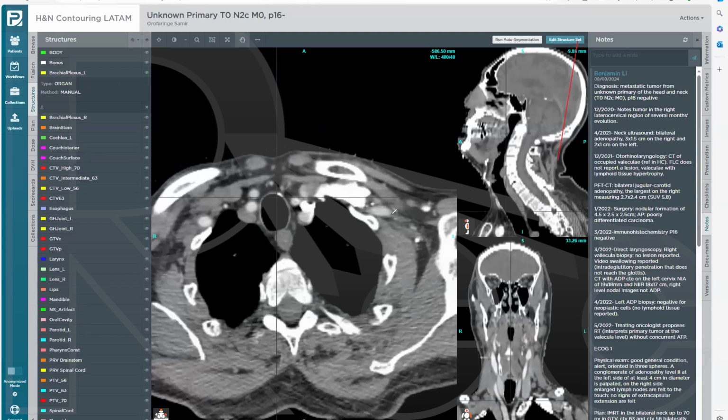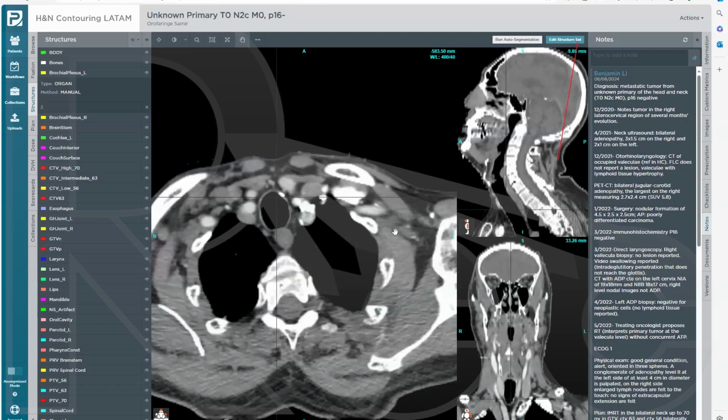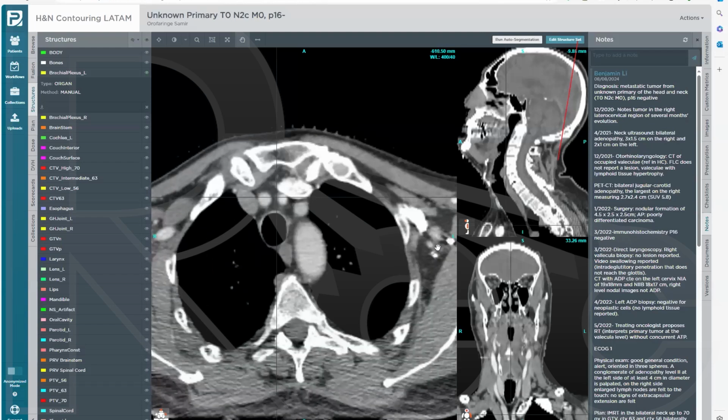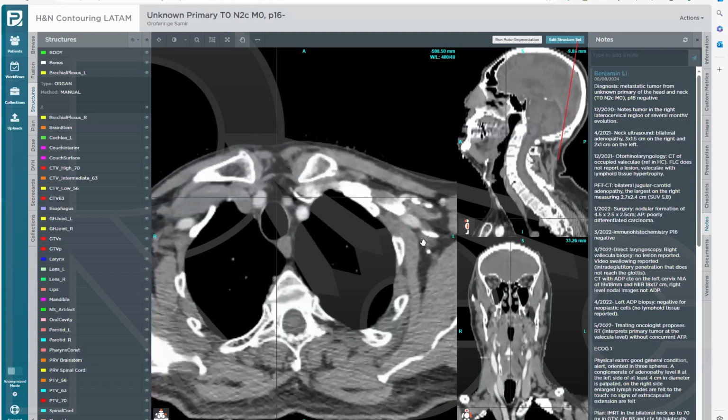So, if you look beyond the subclavian artery, usually you will see here, do you see this? These nerve roots here. So what I do is I like to start inferiorly, find the nerve roots, and then go back up. So I go backwards. I don't go C5 through T1. I go from the bottom of the brachial plexus and go back up. So you see the nerve roots here, you can contour, and I go up. I'm going to keep going up.